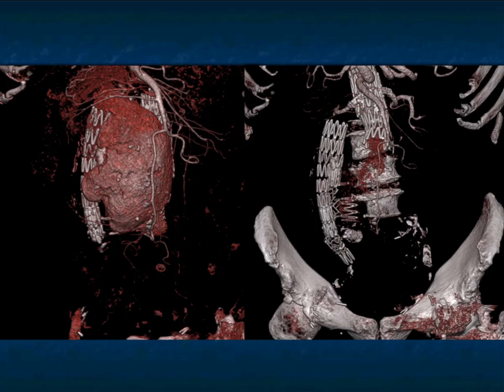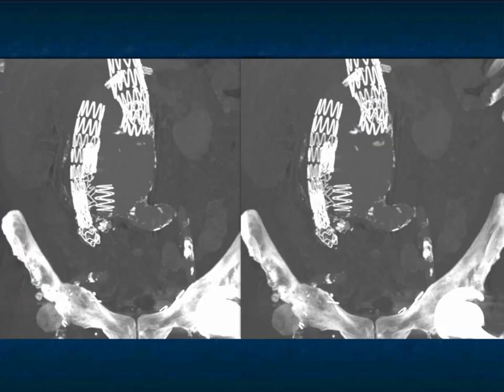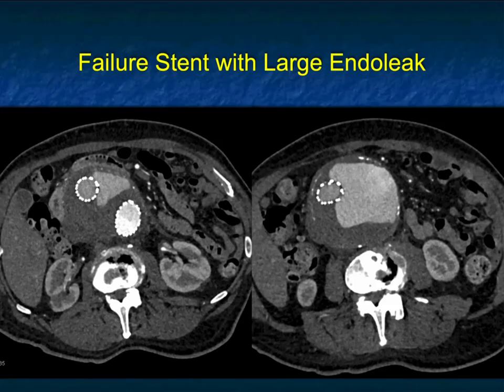An impressive failure, but this patient indeed was very, very lucky. These days we talk about failures of grafting, of planes, of all sorts of technology. This is a good example of, I've never seen this before, where the actual graft dislodges and the patient has a large bleed. I do not know how long that graft was in place. It is a potential complication and was more common in the past than in the current state of grafting, so I don't know that. But just a really, really nice example of this graft failure.